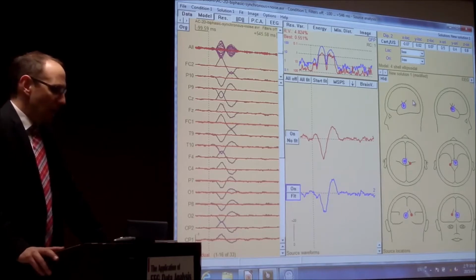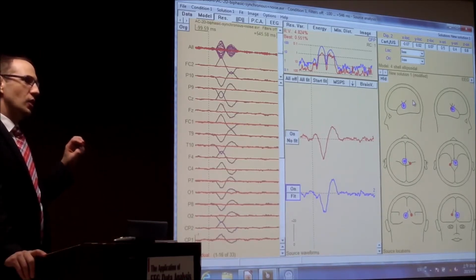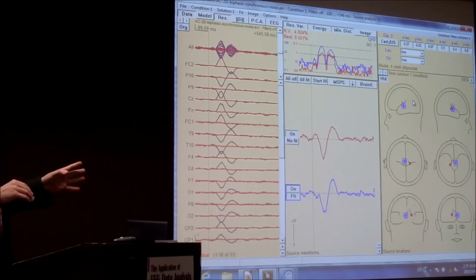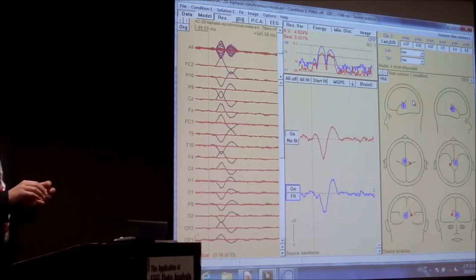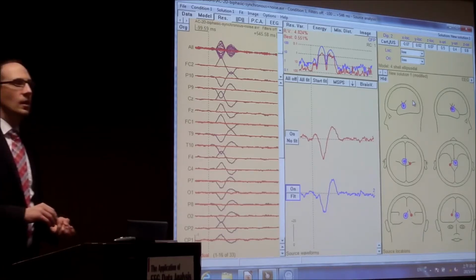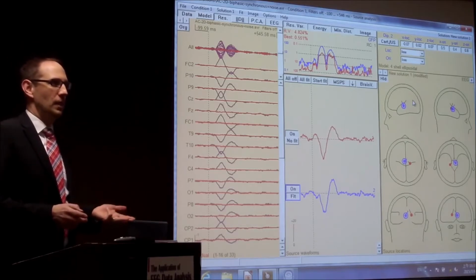So what I wanted to show with that, it's very easy. You saw a very easy problem in the beginning, no overlap, no noise. Very good residue variance. You have a little overlap, synchronous problem, you have a little more residue variance, and now we have the noise within. And now this gives you an impression on how it will look like in real data, where muscle artifacts come in and everything you can imagine.